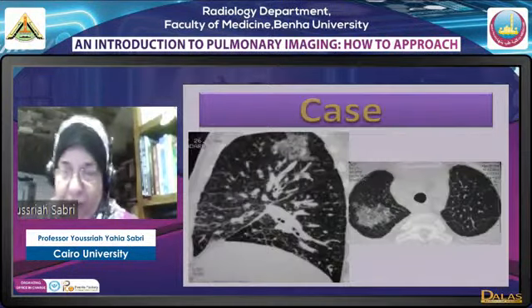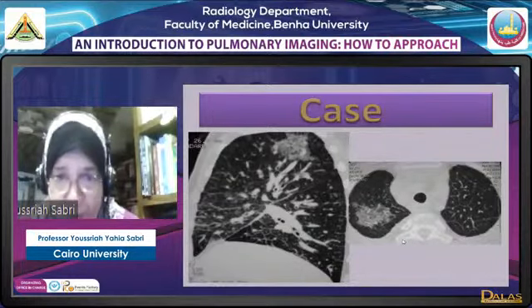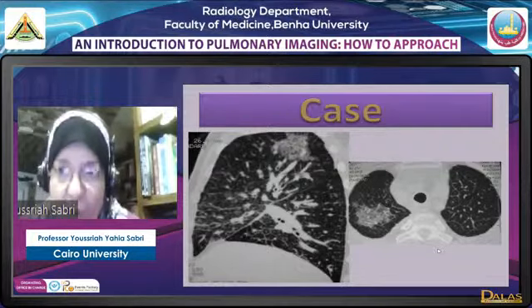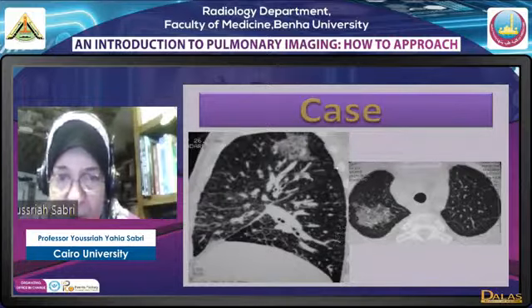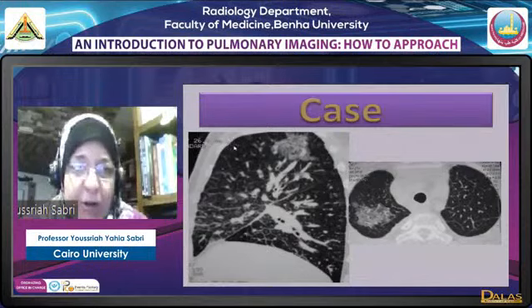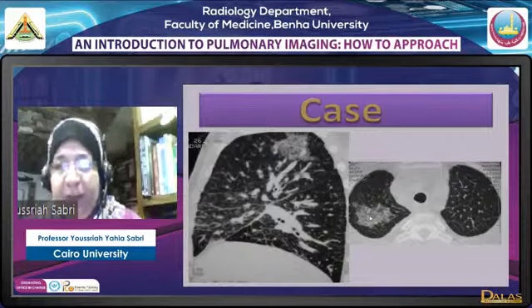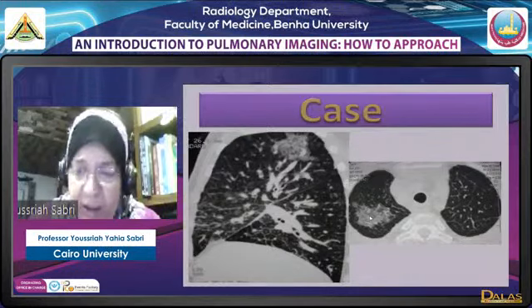When do we see such a thing? Number one, we see it in a case of lymphangitis carcinomatosa. Here, as you can see, we have interlobular septal prominence, and at the same time we also have perilymphatic nodules. So in addition to the interlobular septa, we have beading of the fissure, we have centrilobular nodules, as you can see basally here, we have beading of the interlobular septa posteriorly if you look at the wall, and we have also prominent bronchocentric interstitium. This patchy ground glass opacity that you see is due to post-irradiation. This was a female patient with mastectomy, irradiation and chemotherapy.